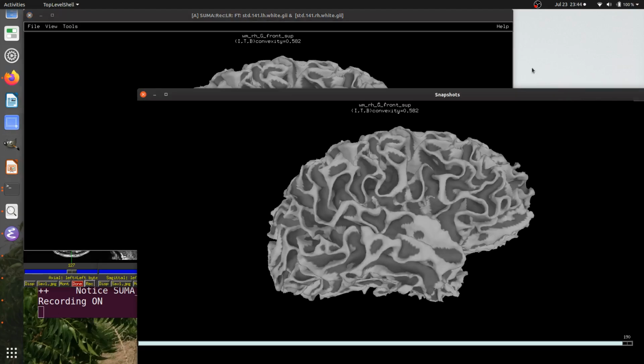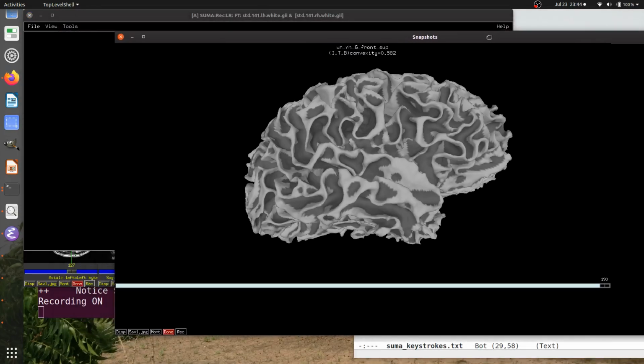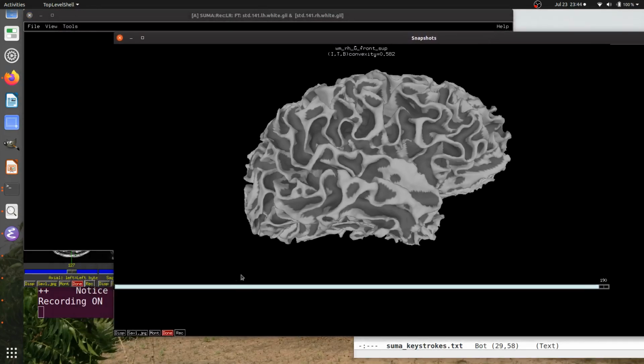Okay, so let's say I'm done here. Now nothing has been saved yet. This works very similar to the AFNI case. There's a save button here. If I look at it, I notice in very tiny font it says .jpeg, so it's not about to save a movie format, which would be different. So I'm going to right click on it, and down at the bottom here, depending on how your computer is set up and your dependencies, you might have one or both of GIF and MPEG formats. I'm just going to select MPEG for the moment. Okay, and I hit set.